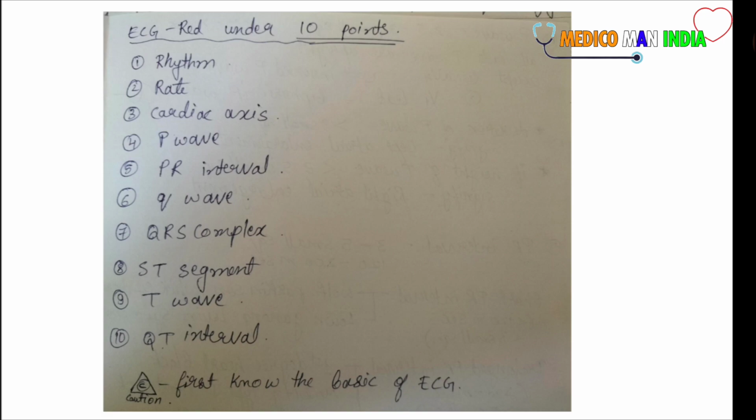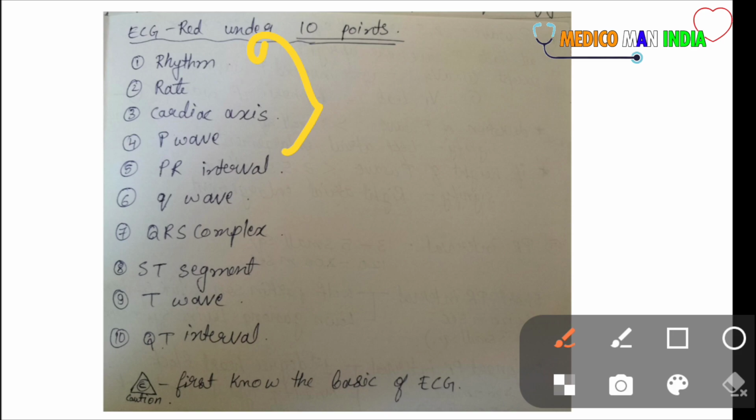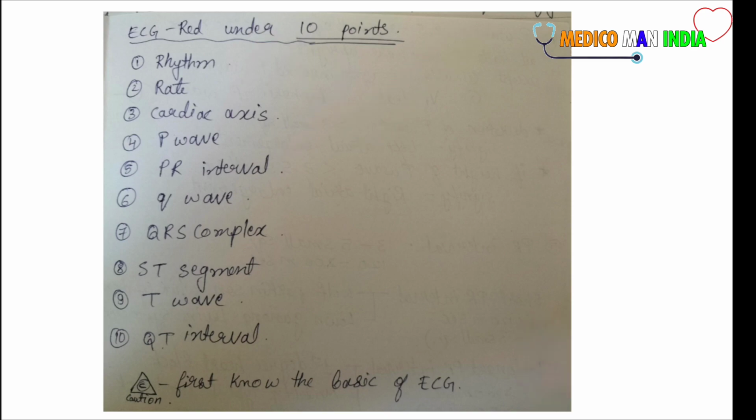Okay, here we will approach the ECG. In this we will learn only the first three things. These are the most important things. Okay, rate, rhythm and the cardiac axis.